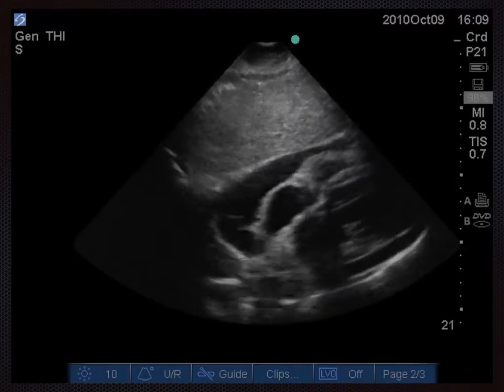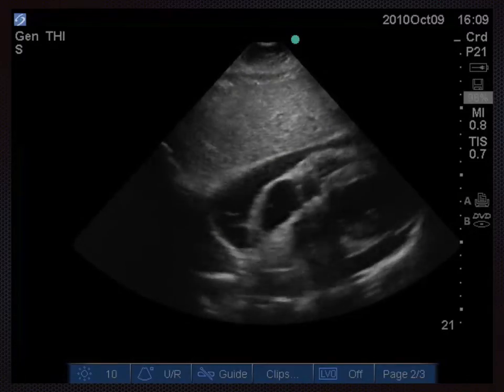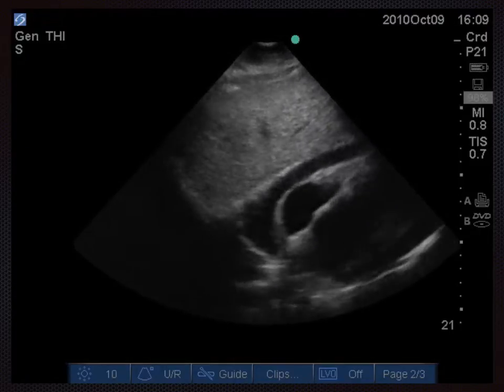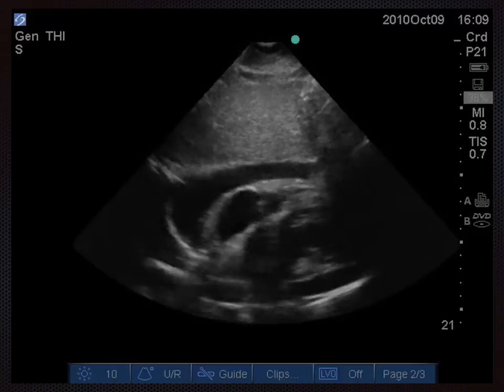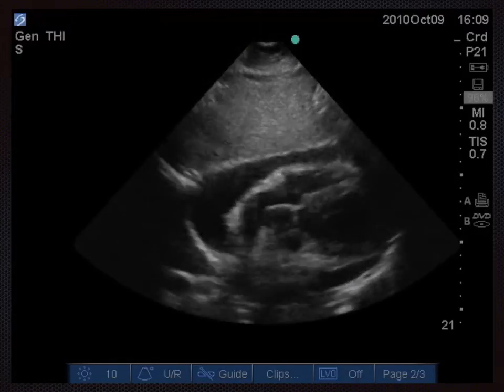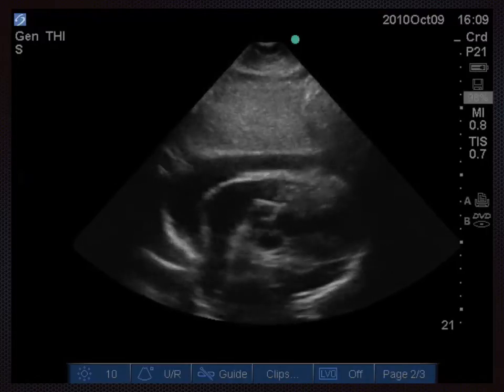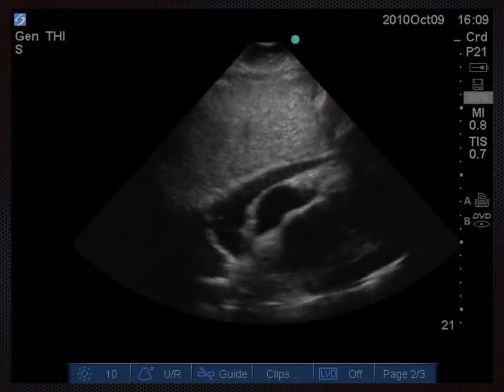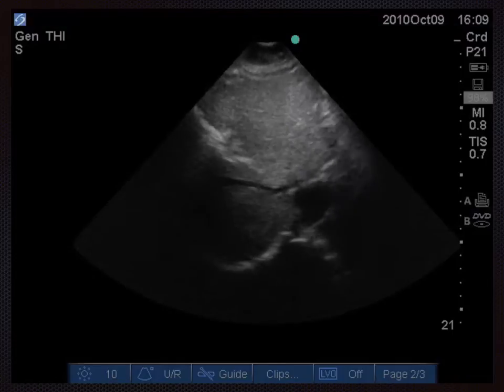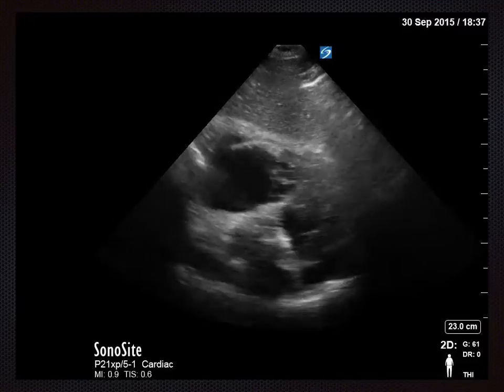Now, not all pericardial effusions cause tamponade of the heart, but you can often see some features if tamponade is happening. And this will be squashing of the right side, certainly the right ventricle and the right atrium, in a sort of a seesaw appearance during systole and diastole. So, you're all happy? You can see the pericardial effusion there? Good. Here's another one.